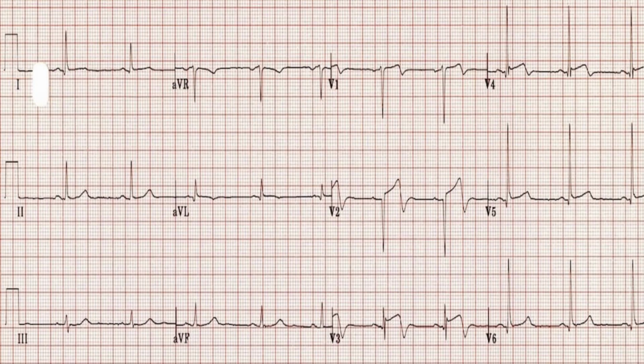That's why the patient is having ST segment elevation, and the culprit artery is the LAD, right? Very good. And in this case, with ST elevation up to V5, can we say it is proximal LAD, as we discussed about the coronary artery, right? Very good. Now you people are becoming pro.